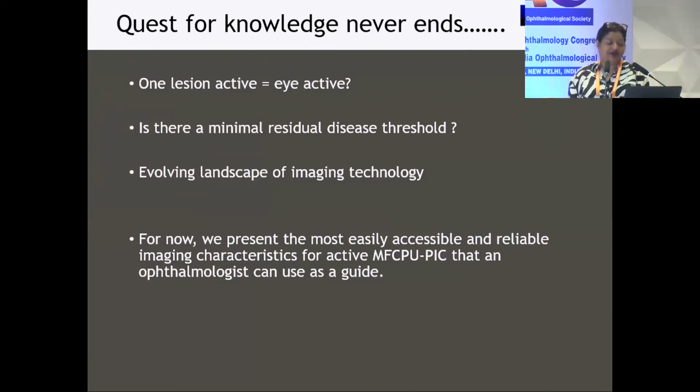So for now, we're presenting these, and we hope that everyone can use this as a guide to diagnose and monitor and look for complications in MFC, PIC, and PEC.